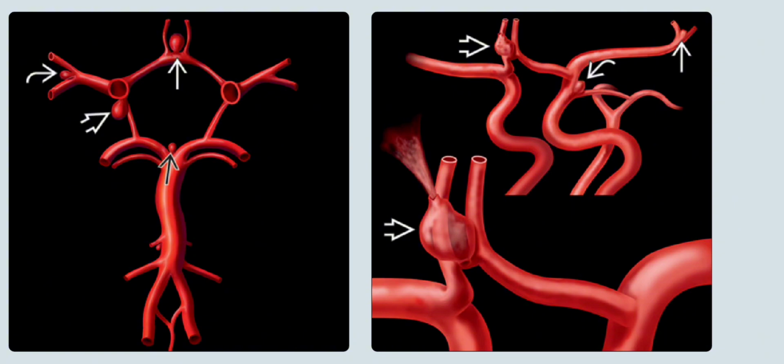Right image is a graphic showing the rupture of an anterior communicating aneurysm with active extravasation from a superiorly directed bleb, which is called the Murphy teat. An additional posterior communicating artery aneurysm and a tiny bleb at the left MCA bifurcation are seen. Patients with these saccular aneurysms have a 20% chance of having more than one aneurysm.